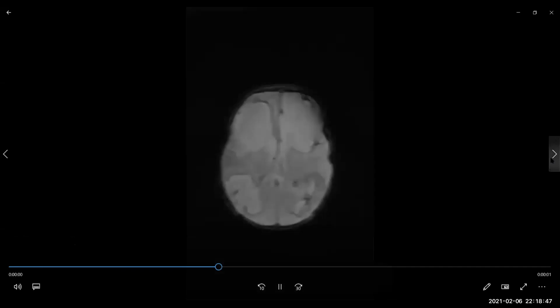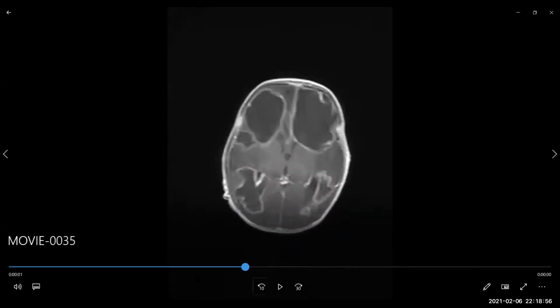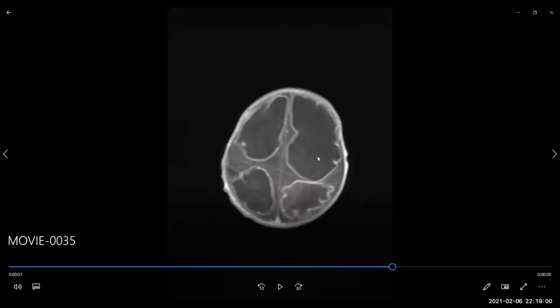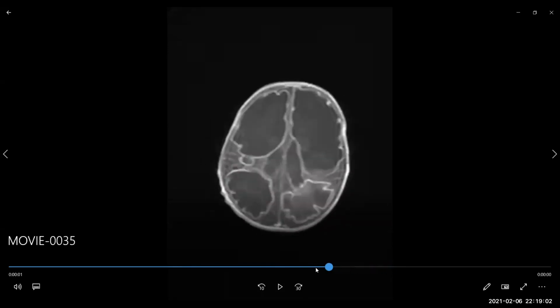One of the abscesses on the left side is also showing T1 hyperintensities. On the post contrast images, there was intense enhancement of these, as well as enhancement of the ventricular lining. The patient was a known case of meningitis, leading to these multiple cerebral abscesses, liquefaction of the white matter, and ventriculitis.